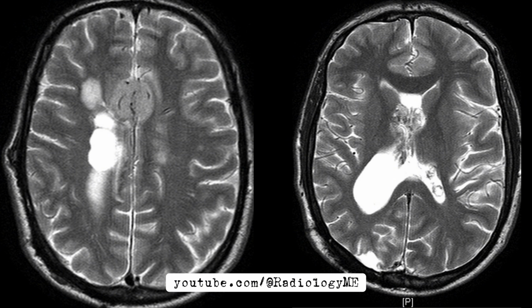pathways. The imaging also shows multiple irregular soft tissue lesions within the lateral ventricles, with the largest one appearing iso-intense on the T2 weighted sequence. There is also notable dilatation of the posterior horn and body of the right lateral ventricle, indicative of mass effect or possibly obstructive hydrocephalus, secondary to these masses.